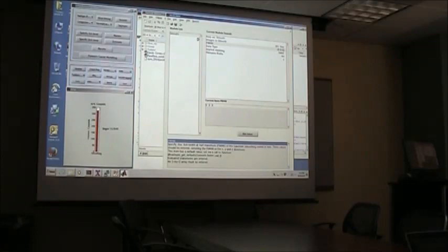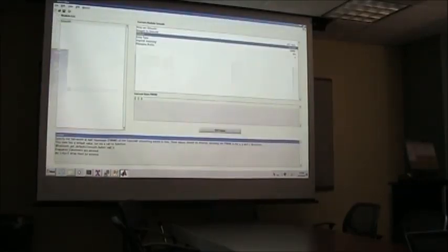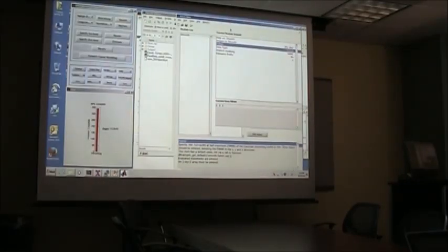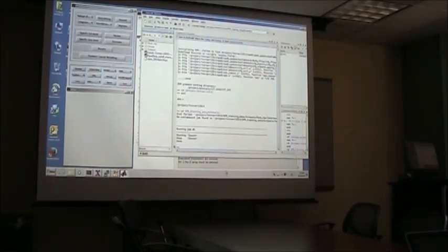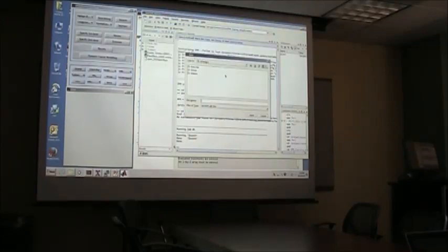Another way would be to load the information in your batch into MATLAB, so in what's called the workspace of MATLAB. And let's see, yeah. So now there it is. Run. And another option, let's see if it's this one.